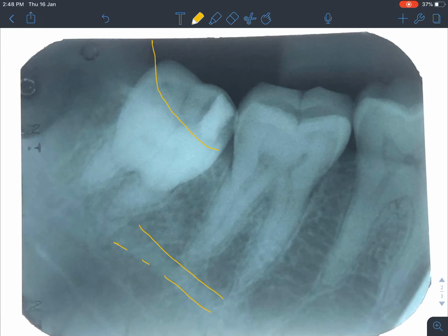Yeah. Any other landmark? Is this the mandibular nerve canal? Yes, inferior alveolar or mandibular nerve canals. So, right. Is there anything else that could be a landmark, or it could be a finding in this area? Go on. Yes. Is this the nutrient canal? Very good. Yes, those are nutrient canals, right? Okay. So now we know the landmarks.